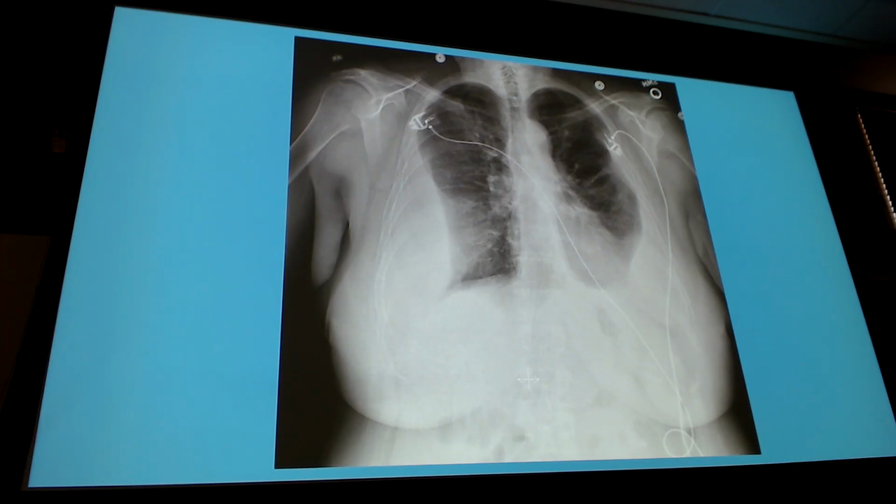Okay? Also got either, can't really fully tell just with this picture, I would need a vignette as well, but my opacities here, okay, definitely got an extra opacity here that's different from the surrounding lung tissue, maybe a little bit on this side. Could this be atelectasis versus a pneumonia? Yes. Which one is it? How's the patient feeling? What's going on? Are they sick? Are they feverish? If they are, I'm leaning towards pneumonia. If they're not, I'm leaning towards maybe an atelectasis that hasn't started pulling things over yet.